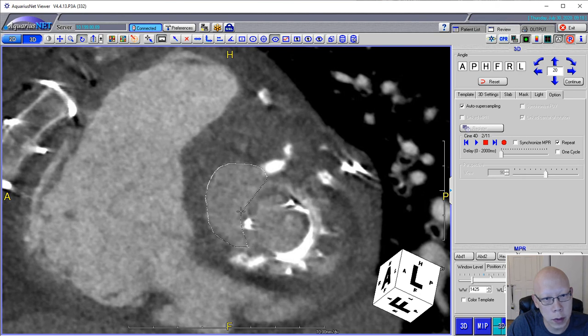So this is roughly the shape of that, and I get about 520. When I've done this before, I got around 600, so it can vary depending on where you draw that measurement. And I think the outside report for this particular case was something like 590. So that's sort of the error bar of this measurement.